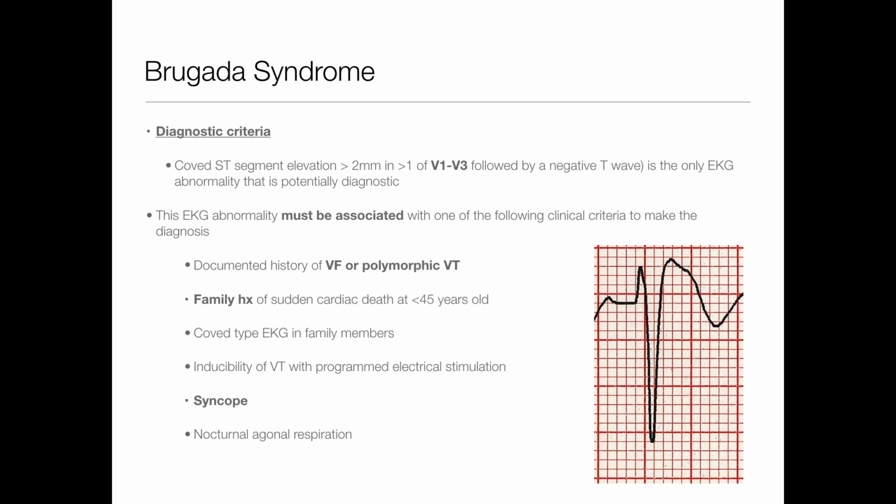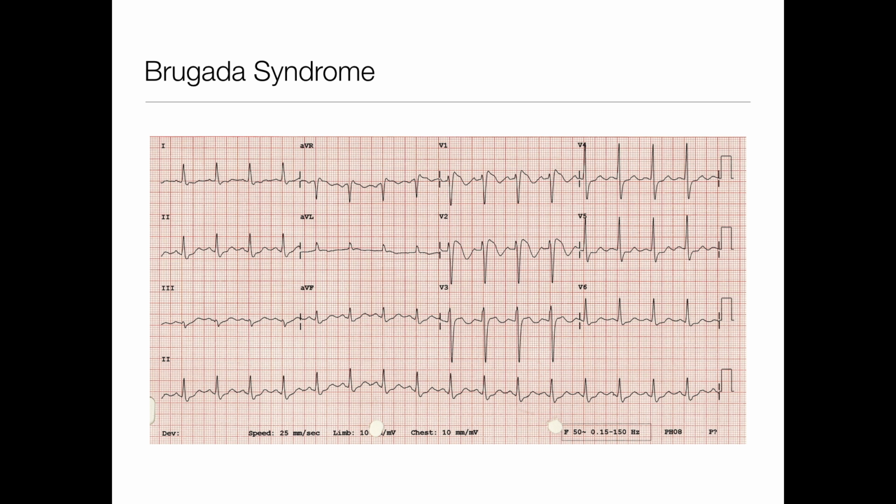Again, Brugada syndrome is another cause for ST elevation. Get used to looking at that pattern. It's something you want to be able to identify on your patients. You don't want to miss Brugada syndrome.